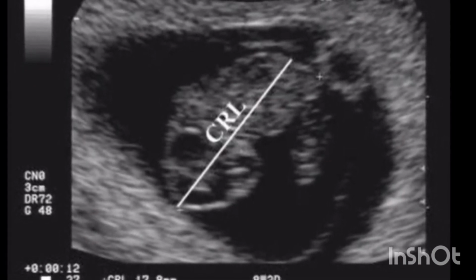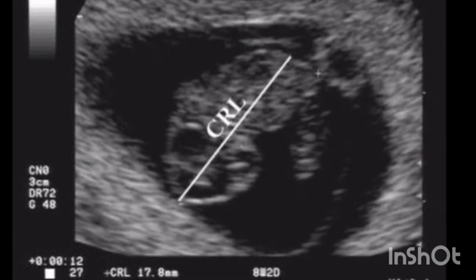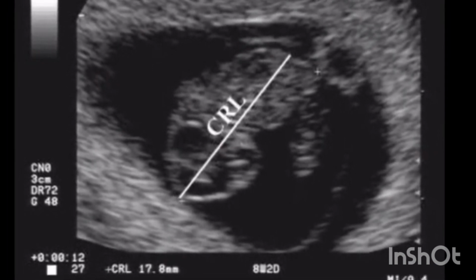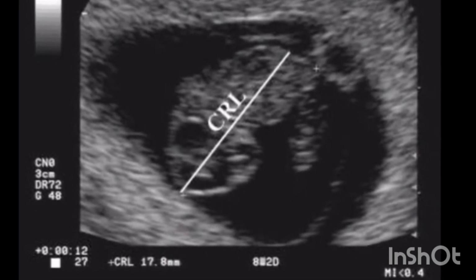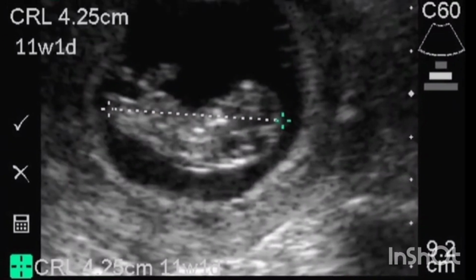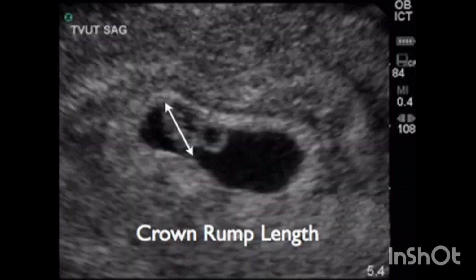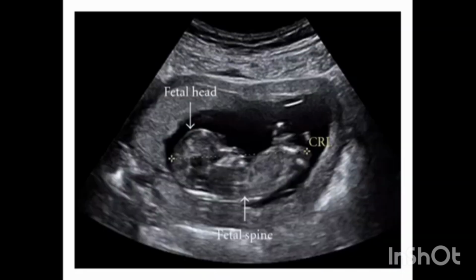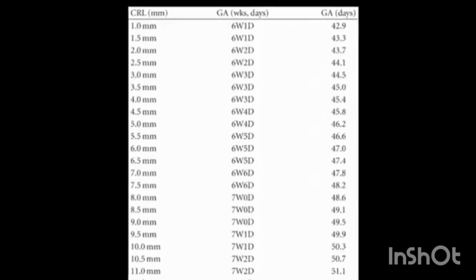The now classical study by Robinson and Fleming on crown rump length is still the main reference for the assessment of gestational age in early pregnancy. There are no significant differences with measurements made by the transabdominal route or the transvaginal route. Because transvaginal scan provides superior resolution and more accurate identification of the embryonic structures than abdominal ultrasound, new charts have been developed for the period of gestation before 7 weeks.